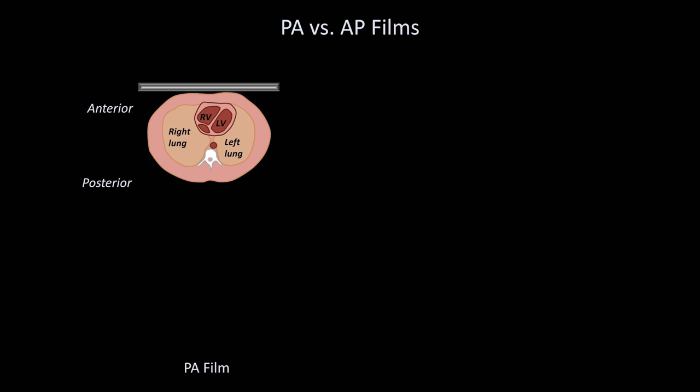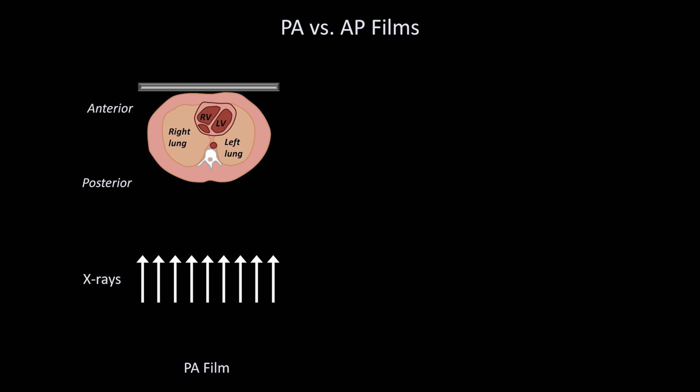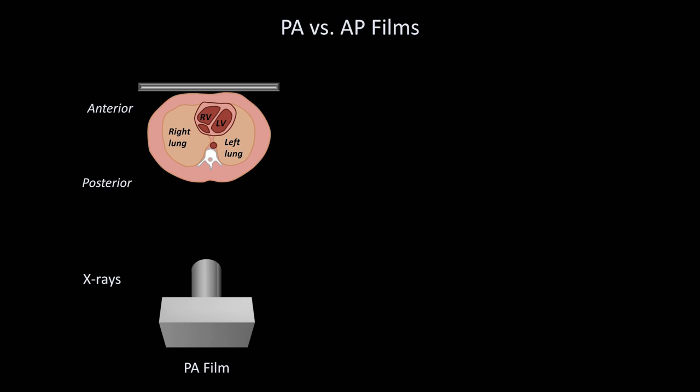In some of the prior videos, I've sort of implied that the X-ray beams which are responsible for creating the X-ray image are all parallel to one another. But this isn't actually true. The X-ray source is a fixed point or close to a fixed point, and therefore the X-ray beams actually diverge outward as they get further from their origin.